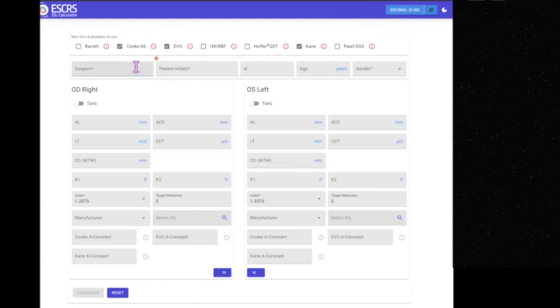So for keratoconus and laser vision correction, go to Barrett True-K measured posterior corneal astigmatism. And by this, all are covered. You don't need to think about other formulas. This is the latest, and I have the article. It's a very nice article.